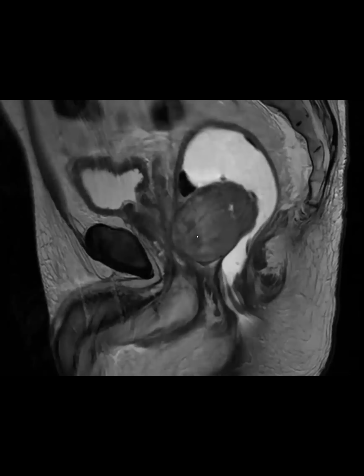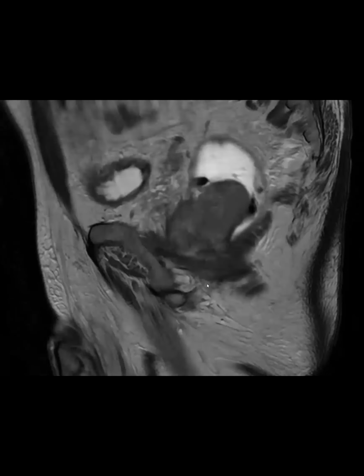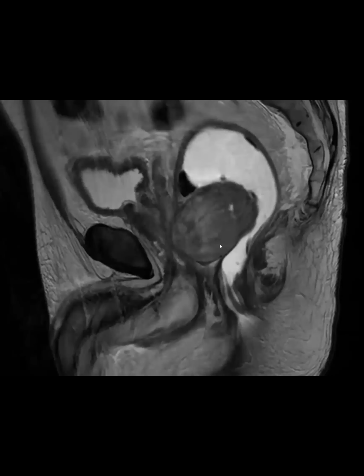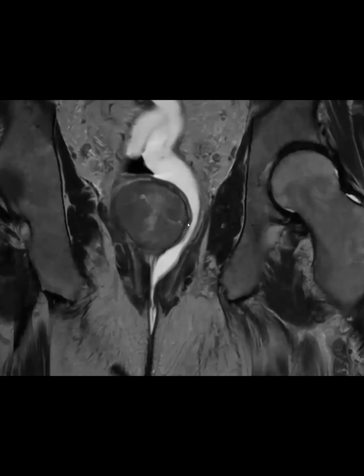So they are currently treating this one with Gleevec to shrink it down to make the surgery easier, and because it was a high risk one as well. Post Gleevec, if you're reassessing this, you're going to use the Choi criteria and look for non-enhancement. It might grow in size, but that is commonly seen with GIST. What you're looking for is devascularization. But yeah, just two cute little submucosal rectal masses.